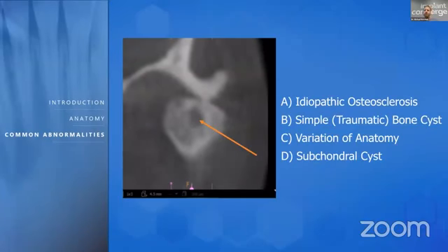Again, there's no single perfect answer. Again, being detectives, we can look at this. These are different interesting findings. Is it idiopathic osteosclerosis? No, there's no sclerosis. It's low density. Okay. Now we also see the other images, the other subchondral cysts.